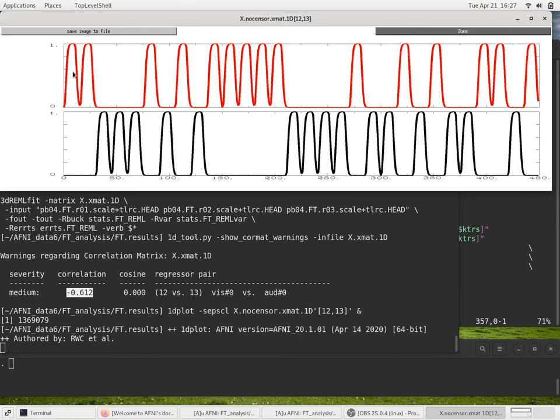Yes. If the audio regressor is high, the visual regressor is almost certainly 0, and vice versa. So that's a high degree of predictability in a negative direction. If this is high, that's low. If the auditory is low, the visual is high. So they are predictive in a negative direction. So there's a correlation of negative 0.612.